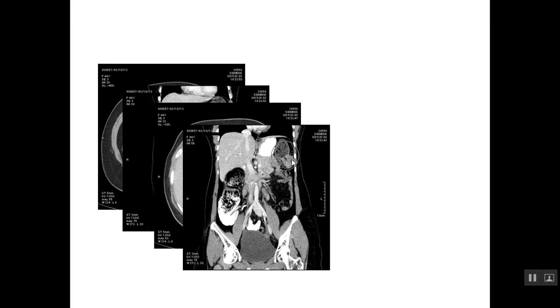The specific point of obstruction is shown here, and the cause of this obstruction is colon cancer. Colon cancer is more common in the sigmoid colon than other parts. But here, after surgical exploration and pathologic sampling, the diagnosis was confirmed as colon cancer.